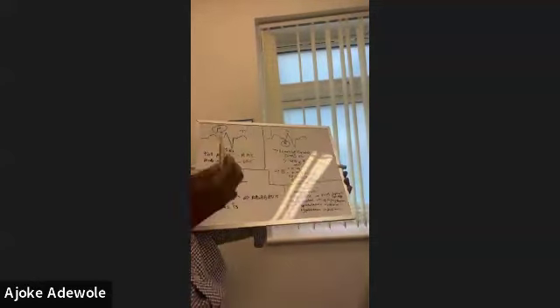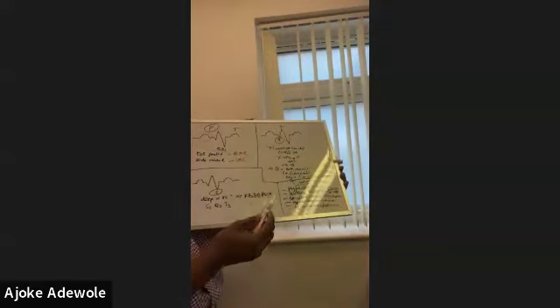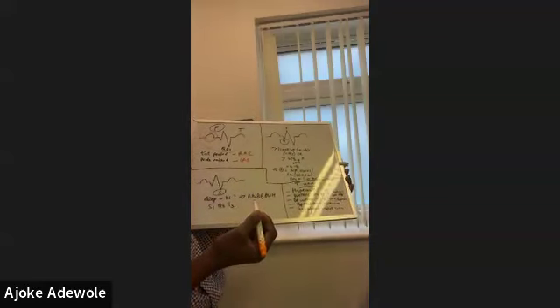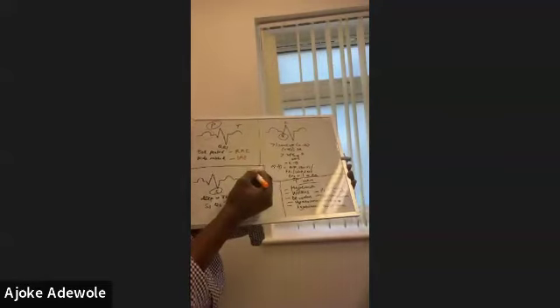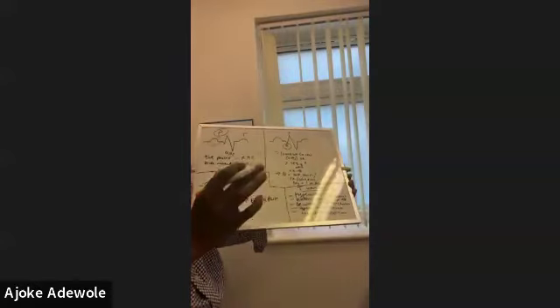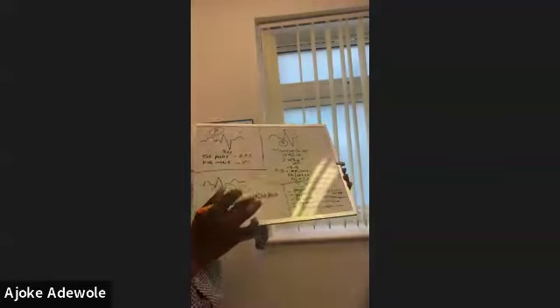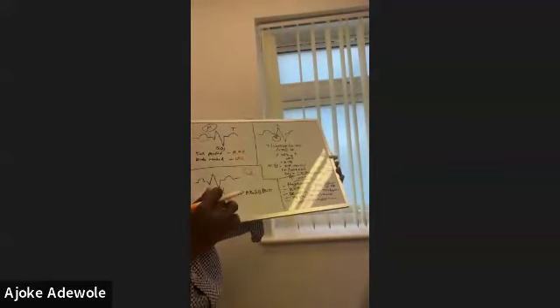Now, the S wave is interesting because, if it is deep in V6, it will be a right bundle branch block or an RVH. There's a lot of technique to it and understanding how the heart works. But basically, for the sake of this short presentation, if it's becoming deep in V6, right?